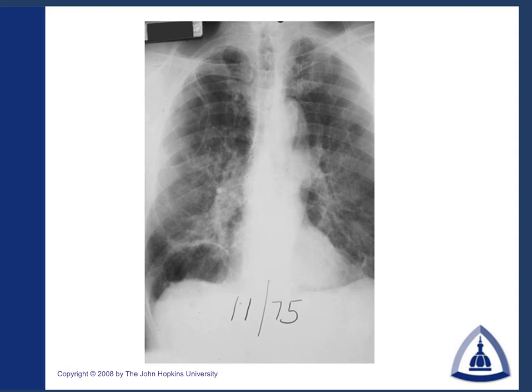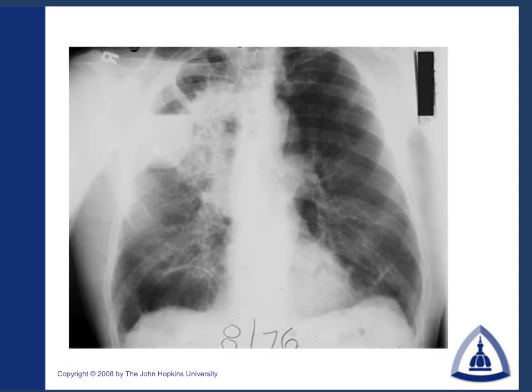And then finally, this is a man with some emphysema, predominantly bullous disease in the upper lungs here. You can see these thin-walled bullae outlined nicely in the upper lungs, who developed fever, shortness of breath, cough, and sputum production, and the way this was billed was a lung abscess.